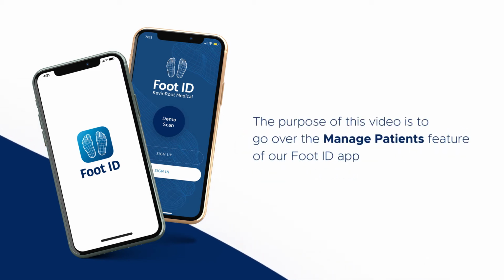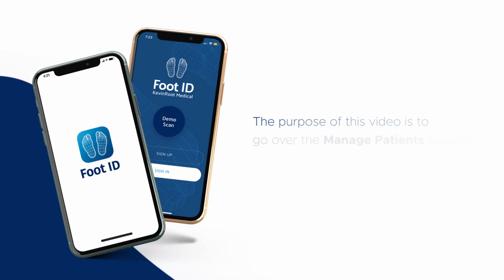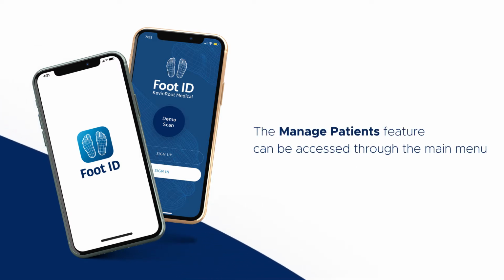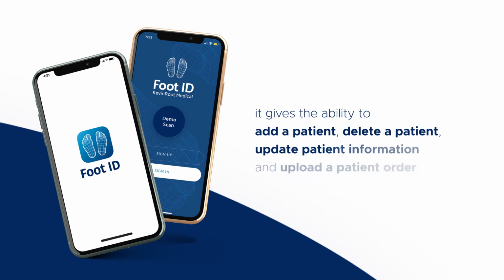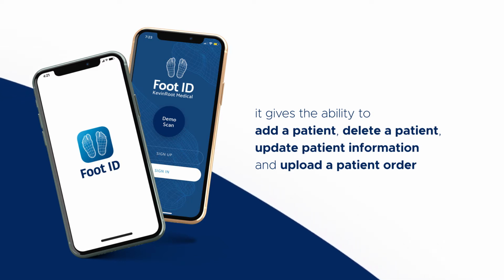The purpose of this video is to go over the Manage Patients feature of our Foot ID app. The Manage Patients feature can be accessed through the main menu, and it gives doctors and clinicians the ability to add a patient, delete a patient, update patient information, and upload a patient order to Kevin Root Medical.